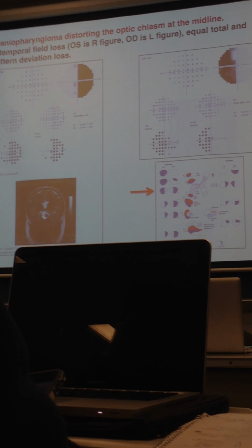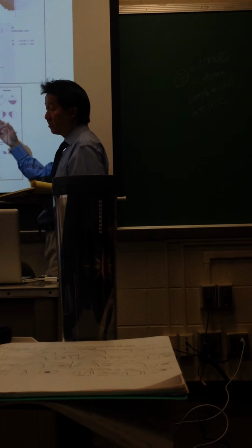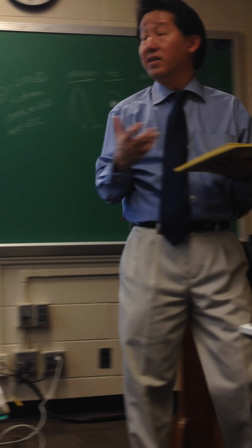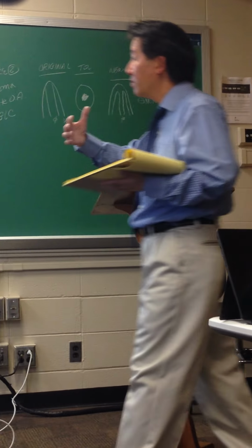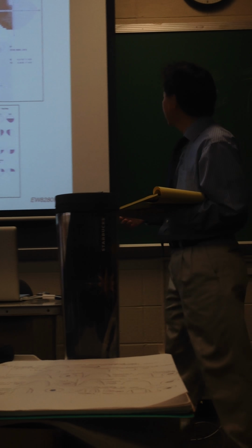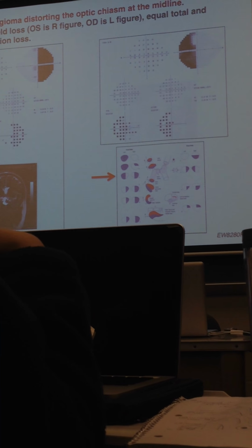Now with all strokes, you'll find that things don't follow the midlines that precisely. There's a callosal exchange. There's some regeneration after stroke within 3 to 6 months. You're going to get some cross-callosal, cross-hemifield recovery. So this is not uncommon to see. But it doesn't follow it as strictly as you might think. Okay, so this is another example of this. Looks exactly the same as this. It's kind of like number 2 there.